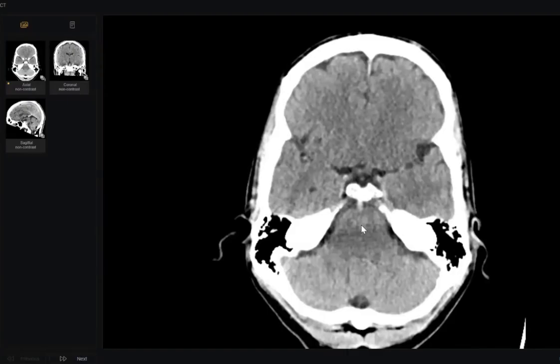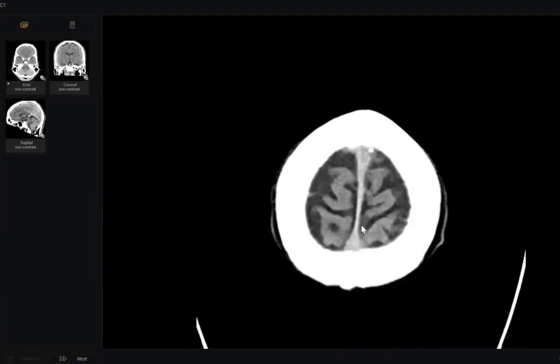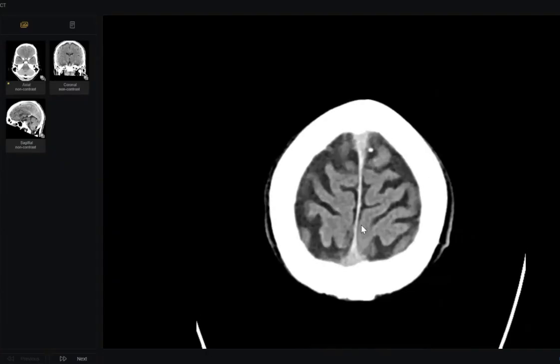Go on. Yeah, I'll just take a minute to scroll through the images, sir. The patient has altered consciousness. I'm not able to scroll, sir. Can you please scroll for me? Okay.